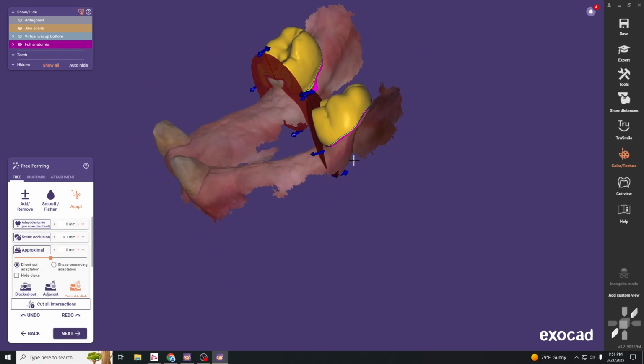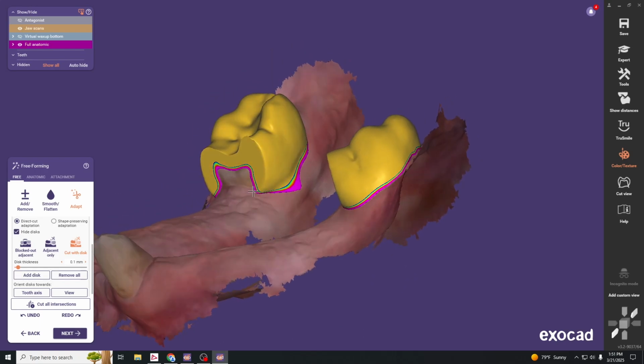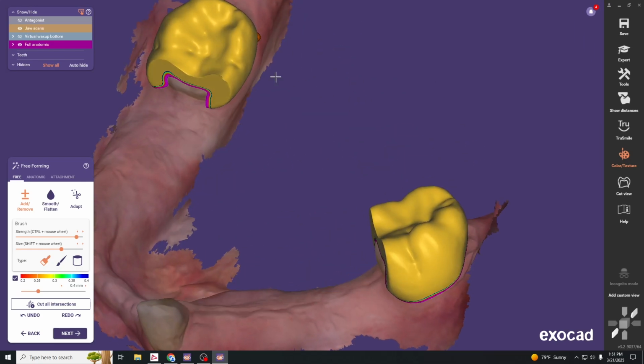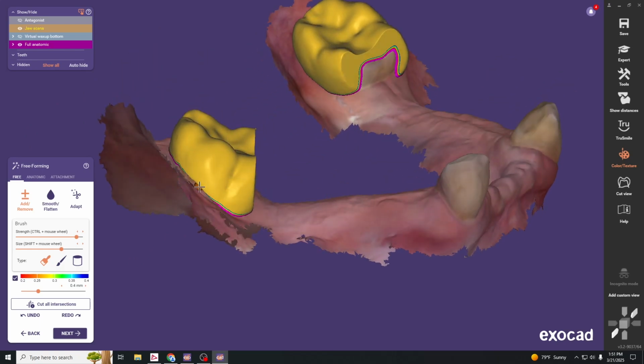If you have any thin spots, you can go back and just smooth if you want to do that. Let's turn this off here by hide discs. If you have a lot of that overlying the soft tissue here, you can go ahead and quickly remove the extra bulk there. This part's not that critical, but it may help so you get something you can visualize that you've seated it properly when you can see a little bit of the tooth sticking out through it.